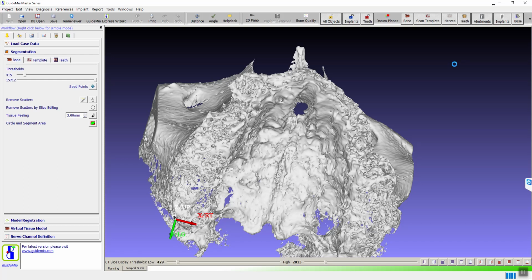Well, this is for the purpose of the bone reduction guide and for printing the bone structure. Obviously, at this moment, with a shape like this, you cannot print it on any computer printer. It's just not possible to print. So we've got to fix it.